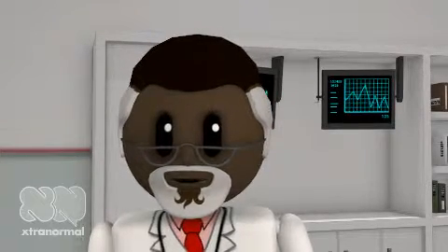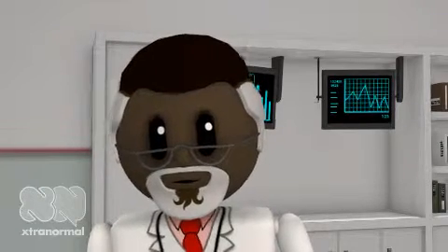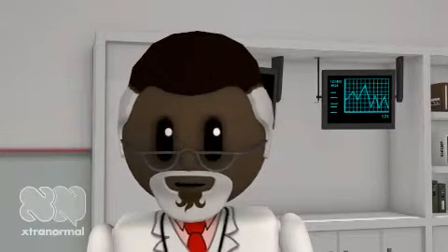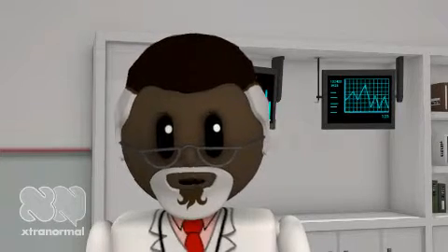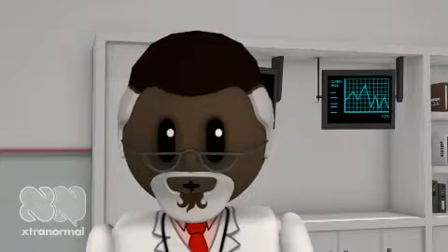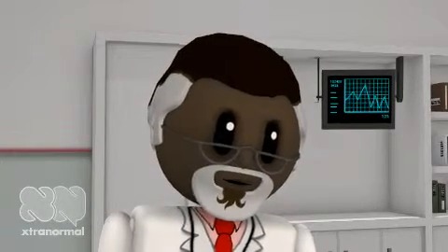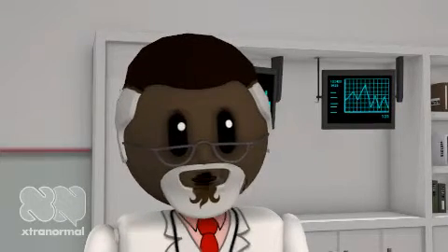Volume targeted controlled ventilation with a constant flow. Flow volume loop demonstrates a square waveform pattern during inspiration, and exhalation is shown in the bottom part of the loop. Pressure volume loop represents a loop characterized by constant volume delivery. The tracing begins at the zero origin and concludes at the same point.